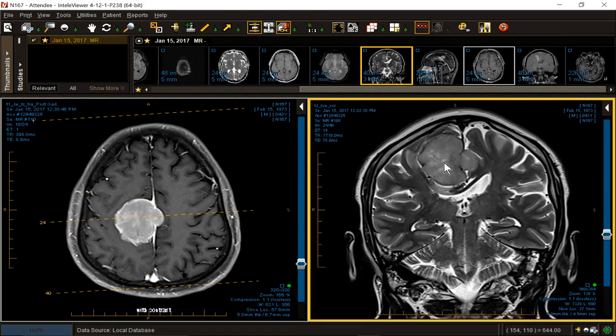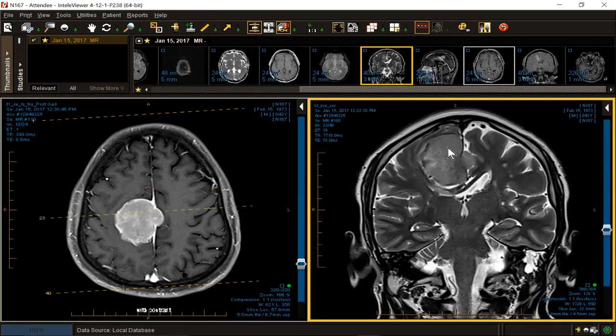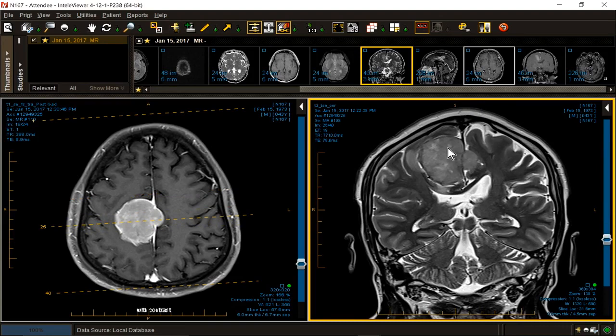Meningiomas typically are intermediate, packed, gray, firm, solid, and desmoplastic. Only occasionally will they form cysts, and usually the cysts are small. You can rarely have large cystic meningiomas, and 1% of the time, meningiomas may be associated with an adjacent arachnoid cyst. They enhance, for you registrars, intensely.